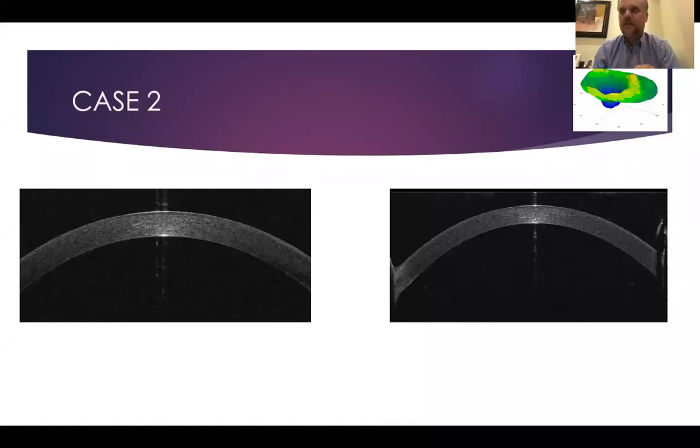In the study of Dan Reinstein, which I have followed for some years, I follow all his publications. So we can, and I will prove to you that with only epithelial mapping you can diagnose a keratoconus. Now the image of epithelial mapping can be a real criterion of diagnosis in keratoconus, more than the anterior surface of Pentacam or other devices. I will show you why.